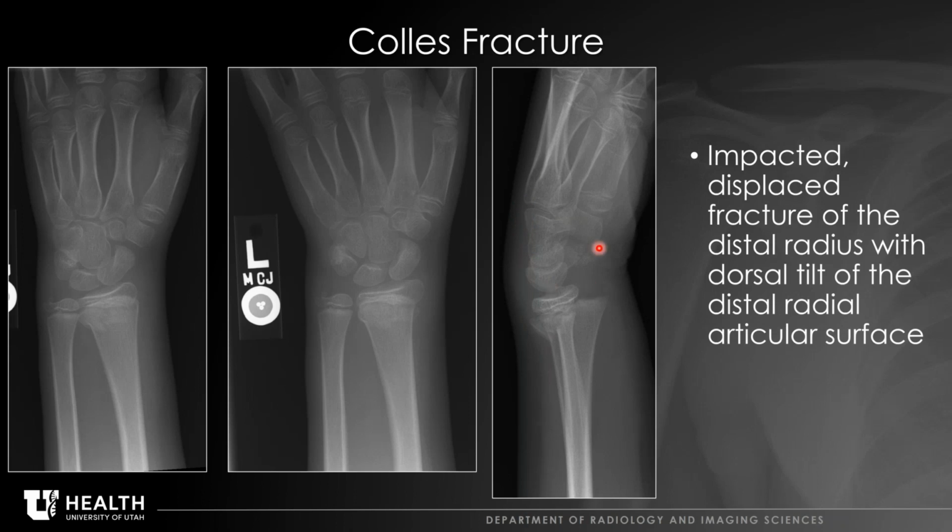And then when we're looking at the volar or anterior, right here we have the trapezium at the base of the thumb, and then the scaphoid projects here. So right here is the proximal part of the scaphoid, and as we go distal, it goes more volar. That's a good question. Really, I look at the hand, and that helps guide me as to what's volar and what's dorsal. Thank you. Yeah, you're welcome. If there are any other questions, people can speak up or give a chat.